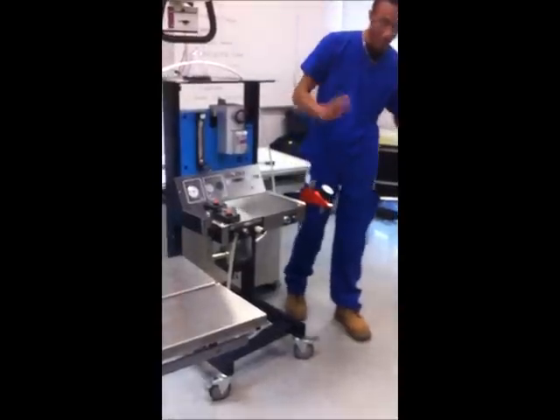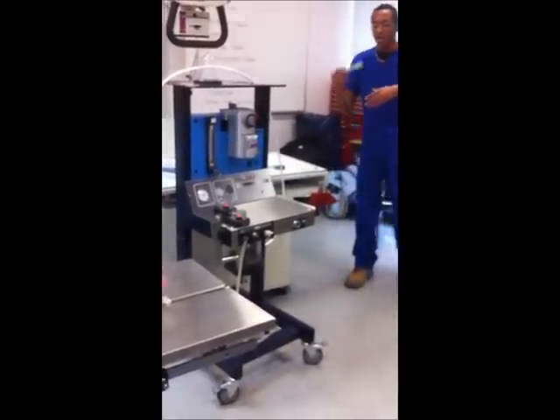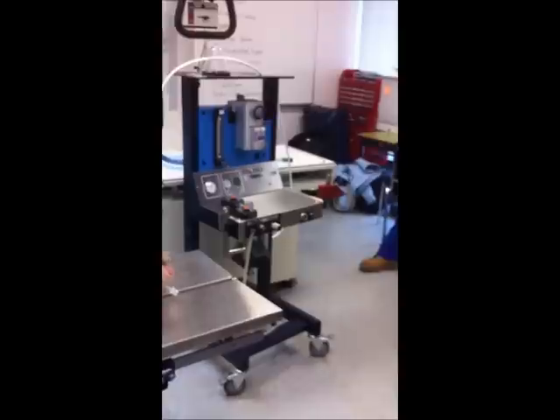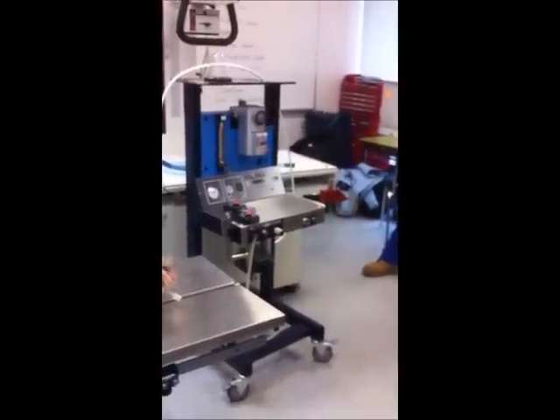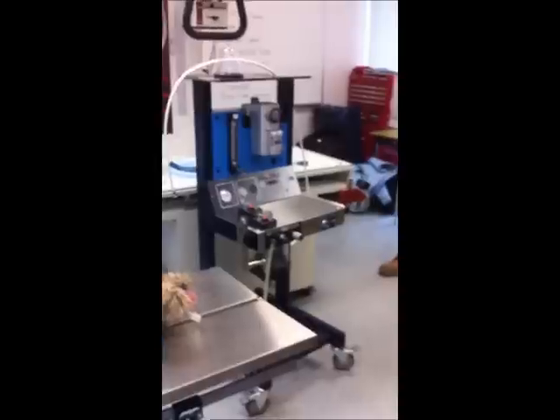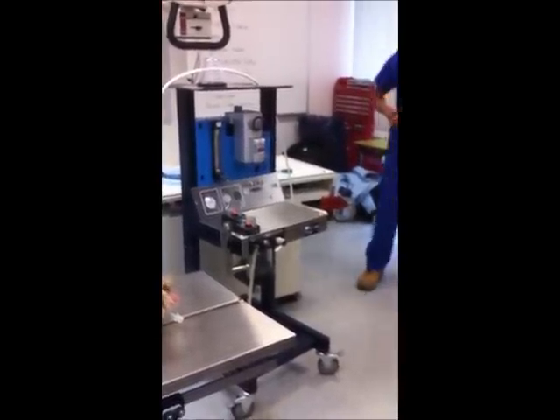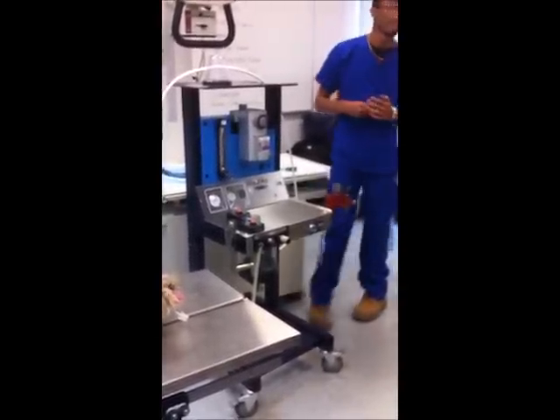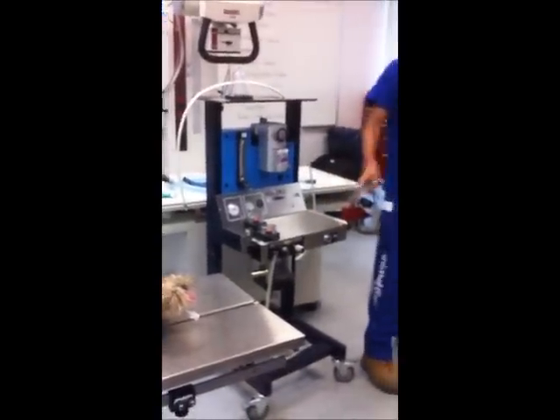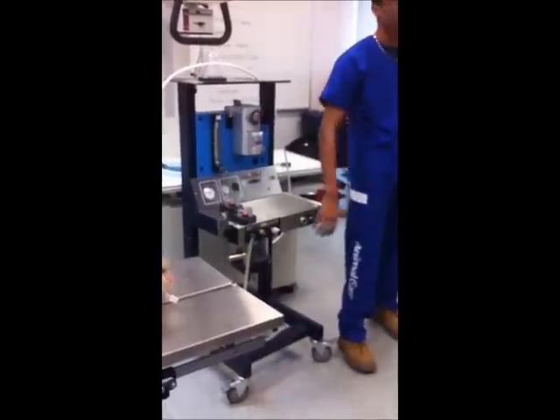And the one with less is the non-rebreathing system. Now that you look at the two pieces of circuitry, how can you differentiate? How would you know which is which? There are actually two things that the rebreathing system has that the non-rebreathing system doesn't have. What is that? The soda lime thingy.